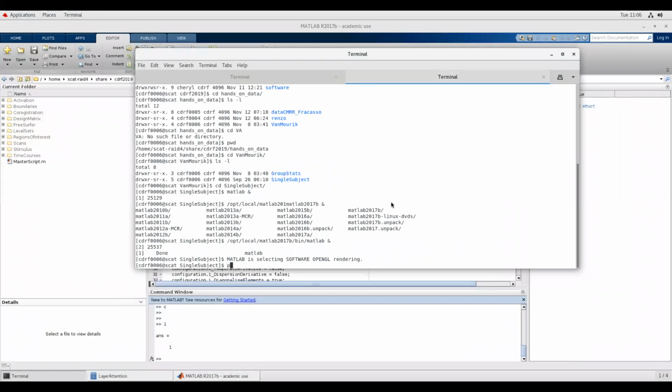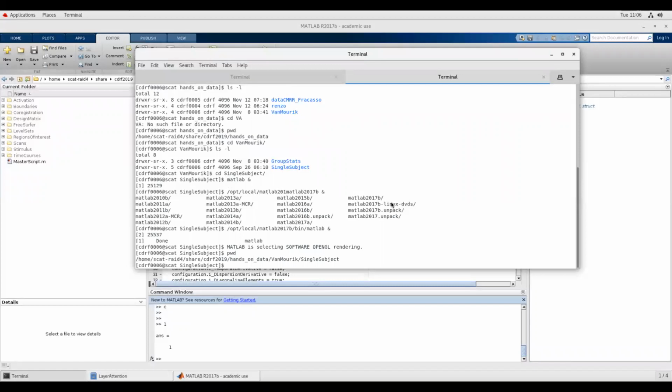Let me quickly see where I am now. For all those that are on the server right now, could you please cd? Wait. I don't think everybody's there. So we're going to freeze in this moment until everybody is in a terminal ready to type. All right? We just need to launch that terminal.